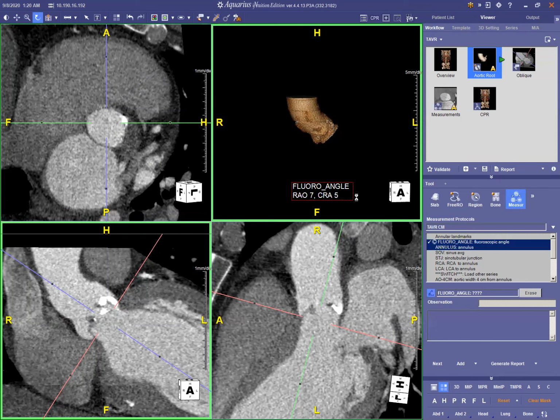It's going to capture that measurement, but we need to capture the images as well on top of the measurements. So after every measurement, I'll hit C to capture, and we can call this the aortic root. It'll go out to the output panel, there, our first image. The next measurement is the annulus. This is the assisted distance pair tool. We left click to activate the tool and then left click and drag on the vessel we're measuring. That's pretty good. If I needed to edit the outline, I'll shift left click to do so.